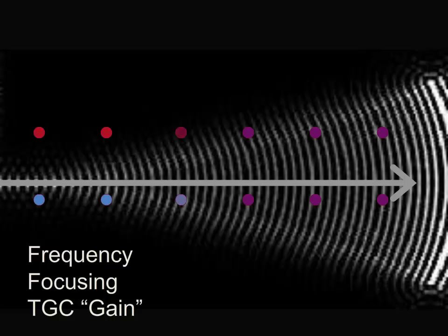Therefore, to optimize lateral resolution, you should 1. Use the highest frequency transducer for the application needed, and not at the expense of penetration. 2. Optimize the focal zones, if those are adjustable on the machine. And 3. Use the minimal necessary gain, which means scanning is best done in a dark room.